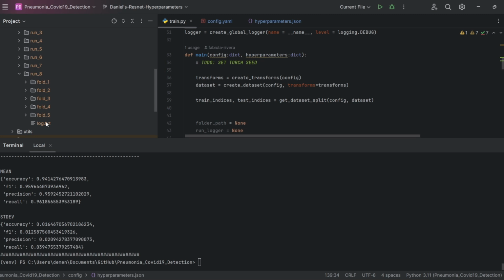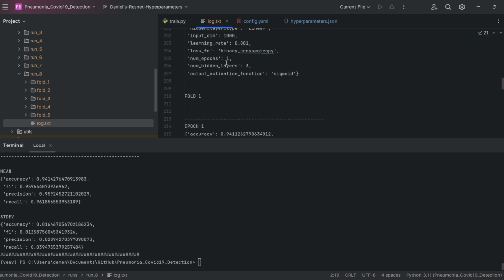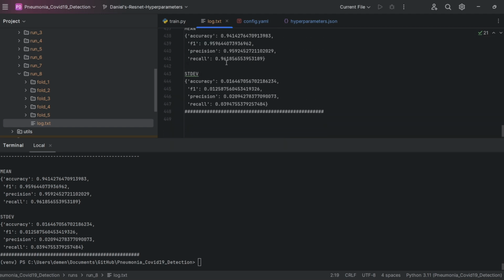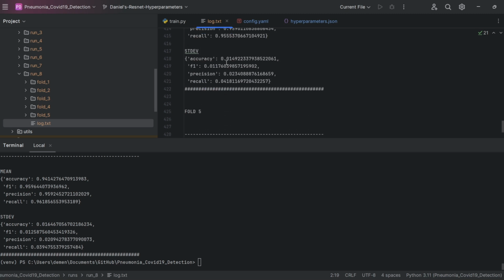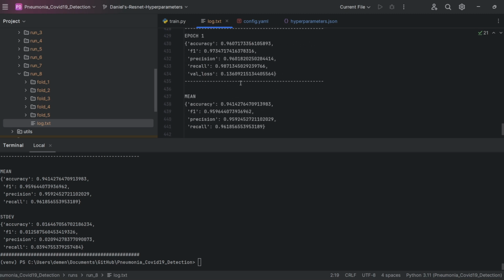And as you can see, the results were printed and they're being displayed here. These are the results that we mainly focused on, which was our mean results because we felt it was the best representation of our results.